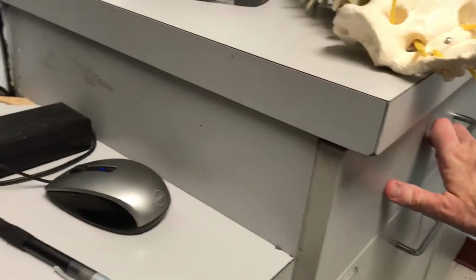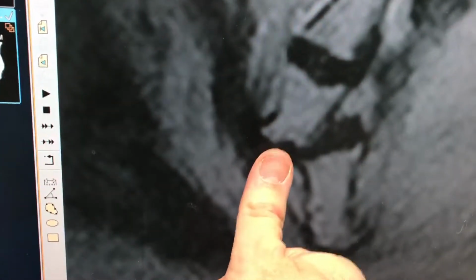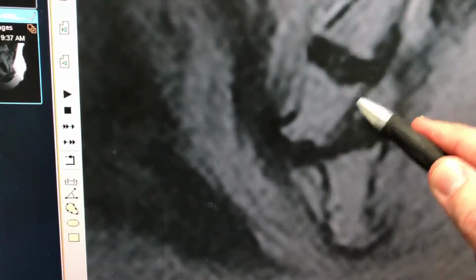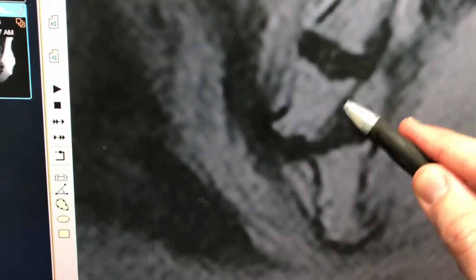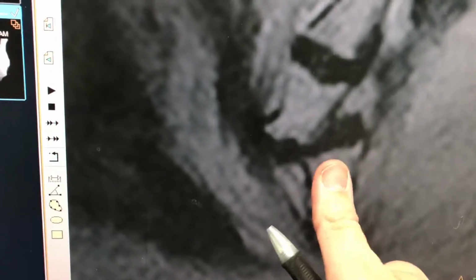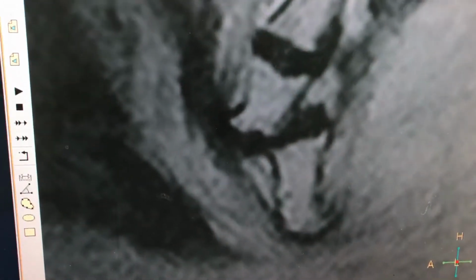And then just like you could decide, well, is a drawer slid 50% open or 100% open, etc. Similarly here we look at how far it is slid out from its normal position under the bone above it. In this case it's essentially 100%, because if you look here along the back wall of the first bone and drew your line down with your mind's eye, essentially none of the second bone is underneath the first bone. So that's a 100% dislocation.